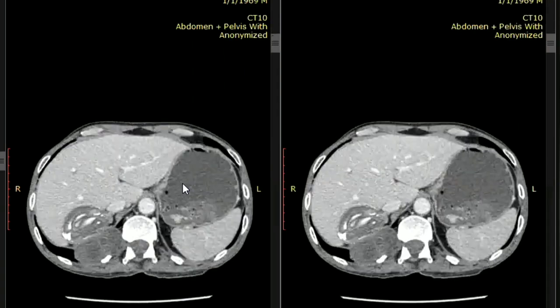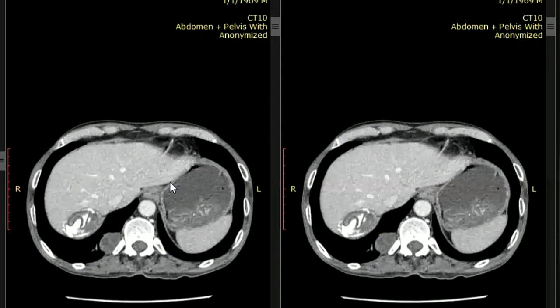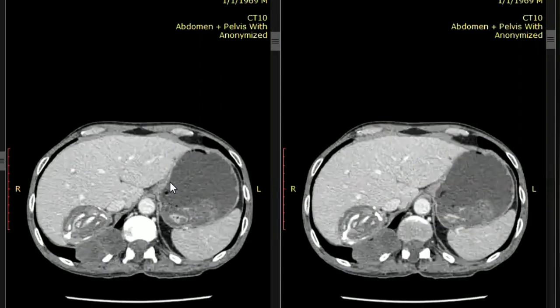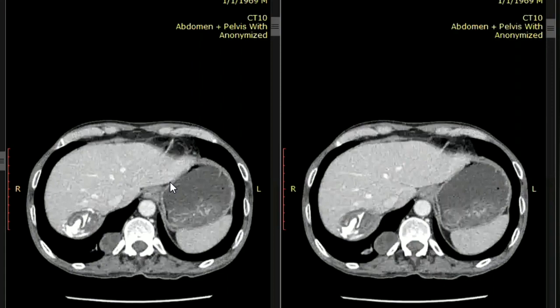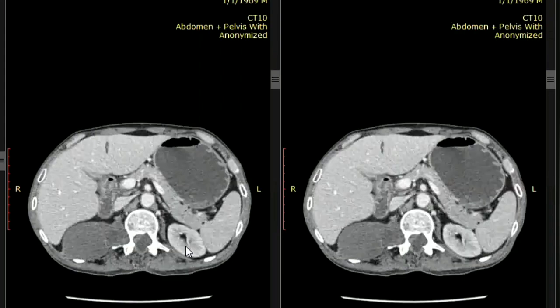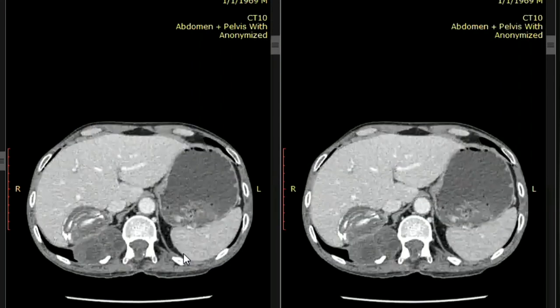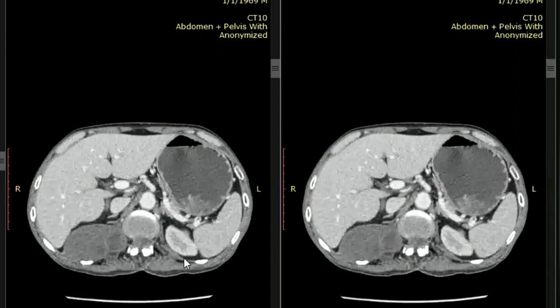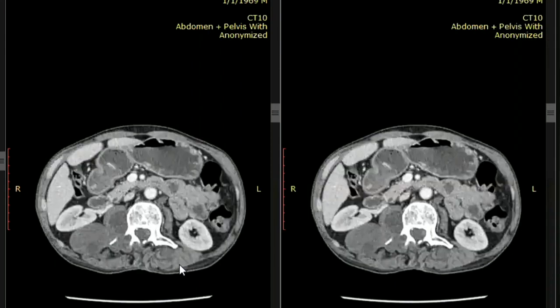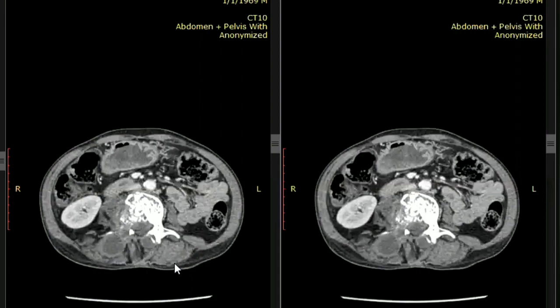There is another well-defined lesion in the right lobe of the liver, segment 8, which is having fluid as well as high density within it. And there appear to be ruptured membranes inside this. It could be an old calcified hydatid. Yes, she's right. This patient came from Afghanistan, and this was a case of multiple hydatid cysts. One was in the liver and subhepatic, and the others were scattered in the paraspinal, posterior paraspinal region, and also involving the bones due to the long-standing process with erosive changes.